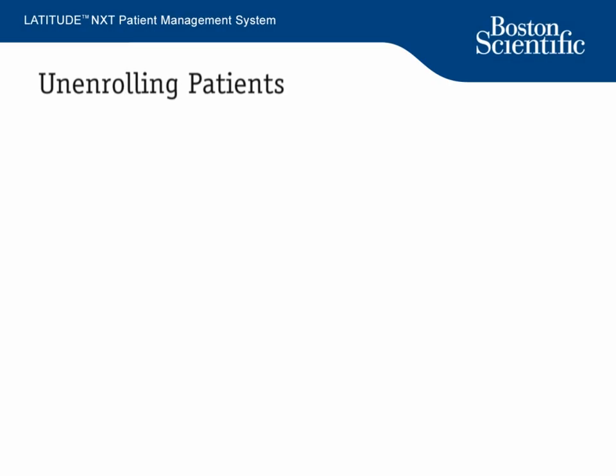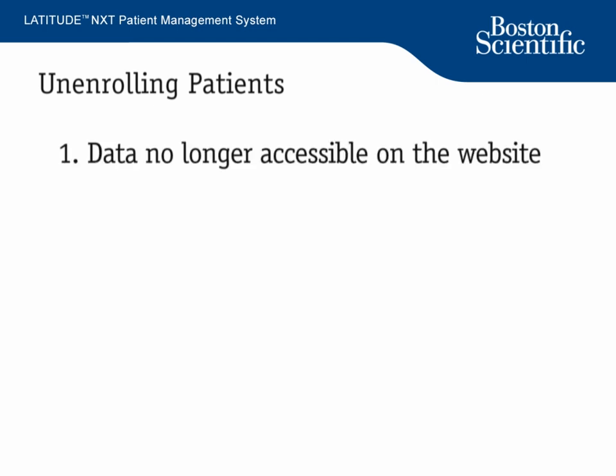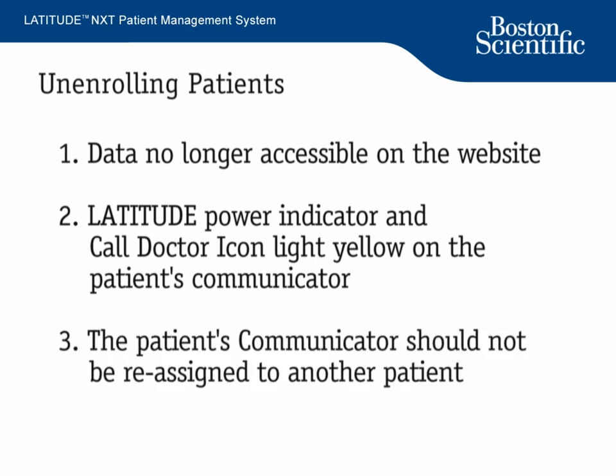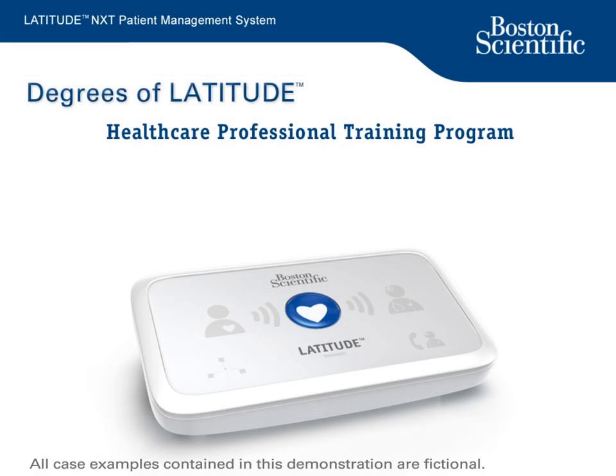Here are a few things to remember about unenrolling patients. Once a patient account is unenrolled, 1. Patient data is no longer accessible by that clinic in the LATITUDE NXT system. 2. The LATITUDE power indicator and the Call Doctor icon on the patient's communicator will light yellow, which may prompt calls to the clinic. 3. The patient's communicator should not be reassigned to another patient.